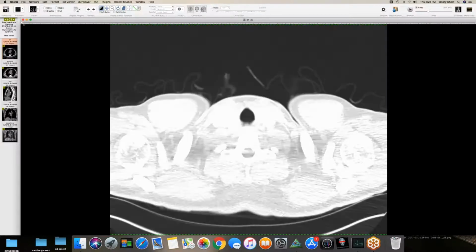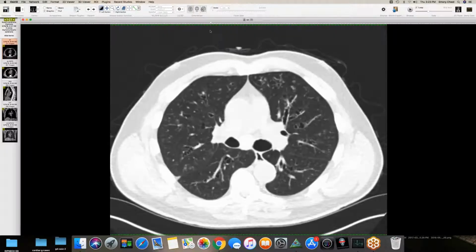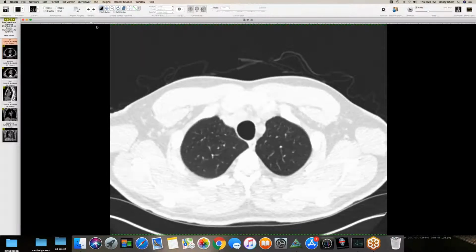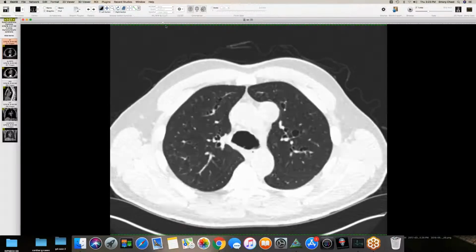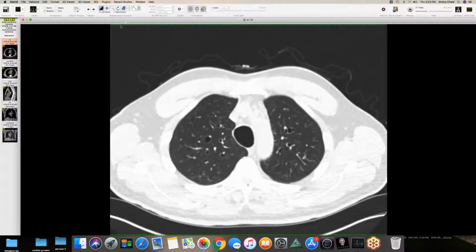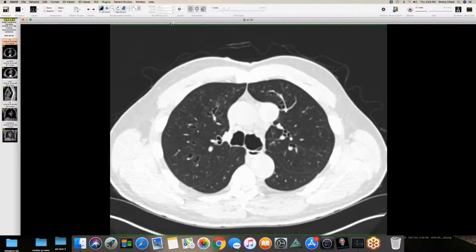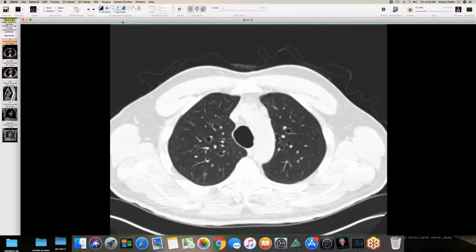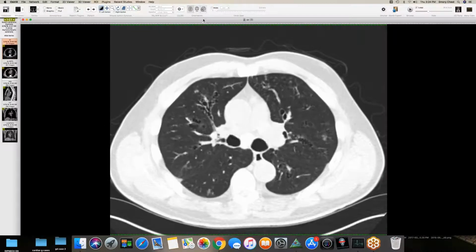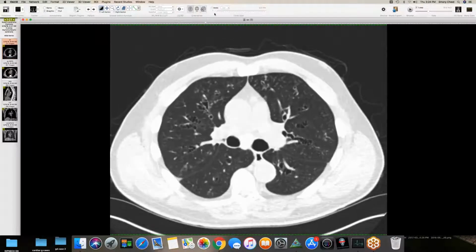I know. And here's another. This is a patient in his 50s, I believe, who has this appearance. You might immediately jump to looking at the trachea and the bronchi. There is tracheomegaly. There is enlargement of the main stem bronchi, and this corrugated appearance here, and you can see the central bronchiectasis, both cylindrical and varicoid.